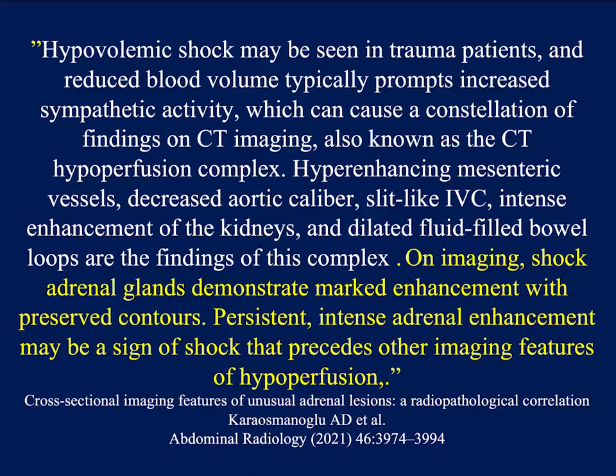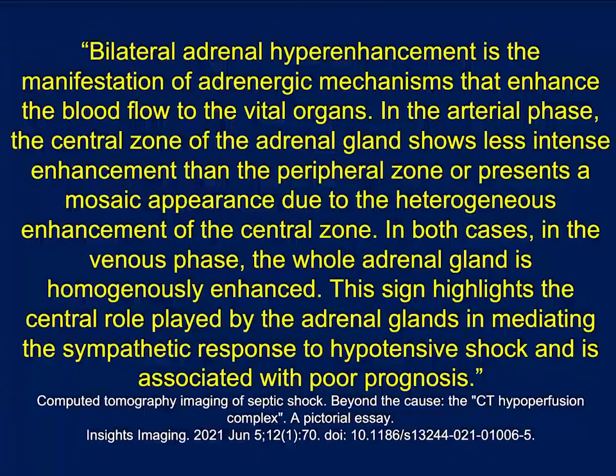When I see the adrenal being very bright, I'll immediately call the physician and tell them that the patient is hypotensive, and this can be a serious condition. Obviously, it's a serious condition, but sometimes no one's sure why the patient's hypotensive. In this article, talking about septic shock and the hypoperfusion complex, bilateral adrenal hyperenhancement is the manifestation of adrenergic mechanisms that enhance the blood to vital organs.